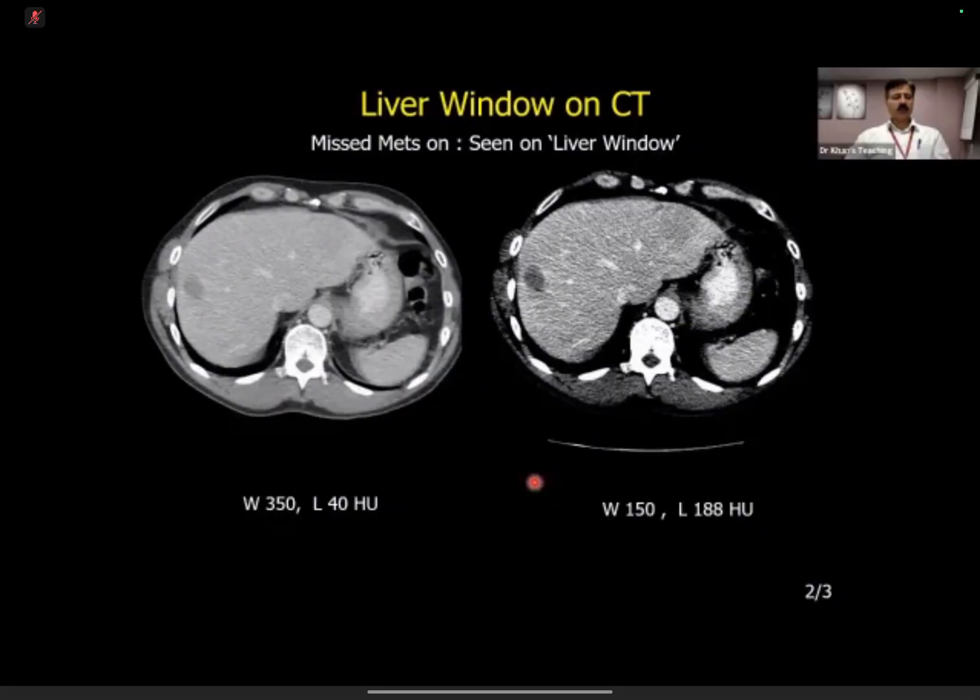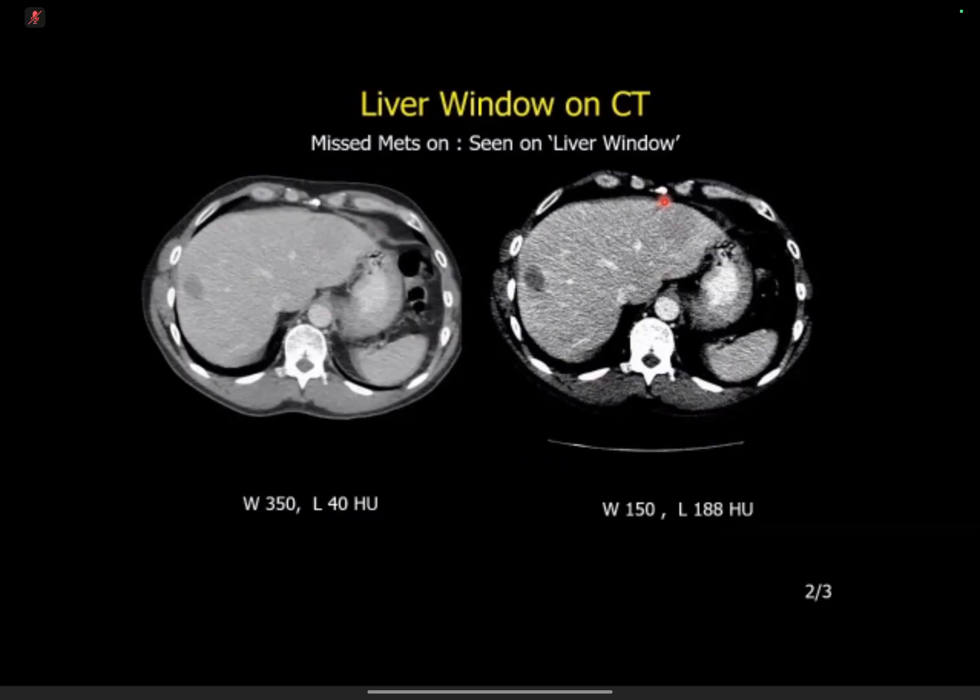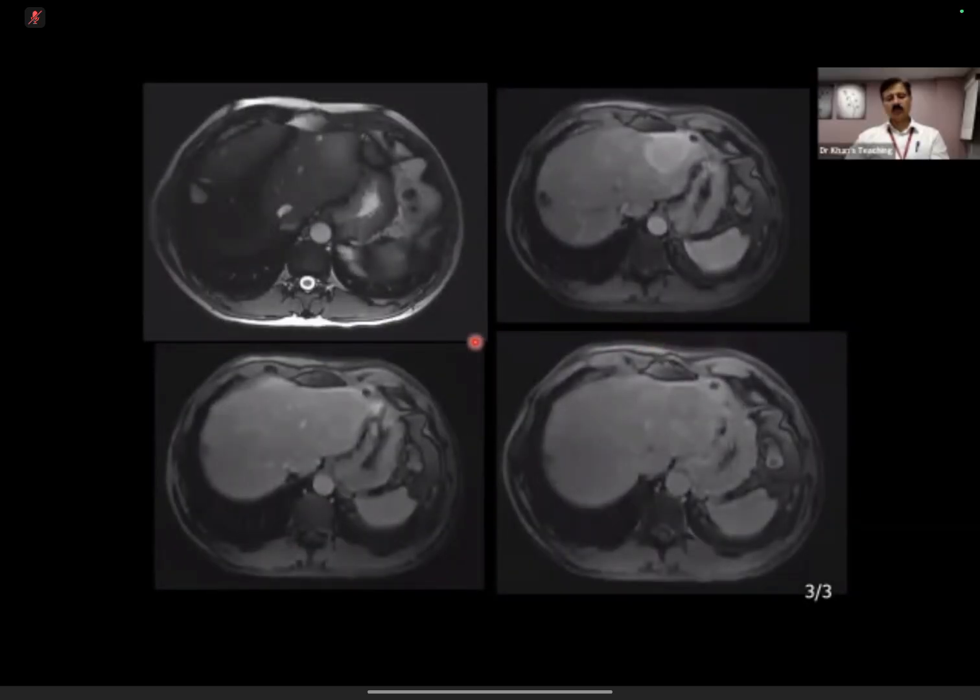So now with this, what do you think, candidate 1? So I'm convinced there is something real there. It's got quite poorly defined margins, and it does look quite concerning. But I'd still potentially use another modality. So this is the MR. What do you think it is?